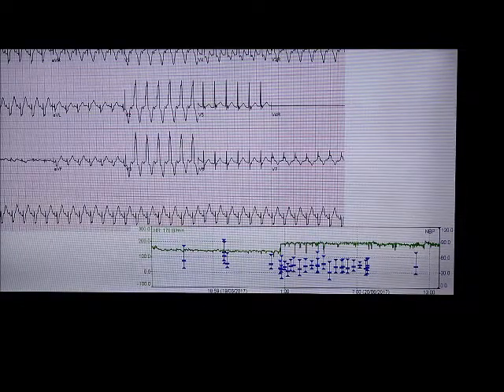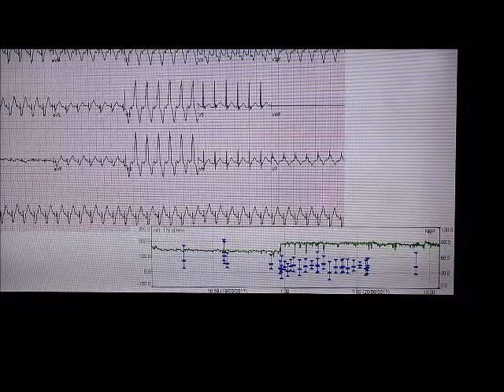Okay. So I'll give you some context. This is a 9-month-old who had tetralogy of Fallot, and you recall the heart rate is persistently around 190 to 200. And he's not hypovolemic, he's not on any inotropes, his function is normal, he doesn't have fever. There's no reason for him to have tachycardia. So this is his baseline. We don't call this narrow complex, we call it usual complex, but we will apply the same protocol as for narrow complex.